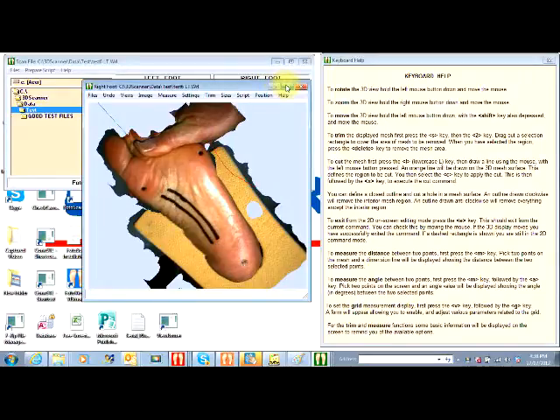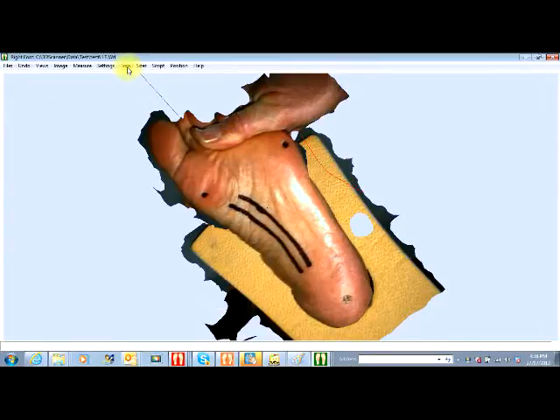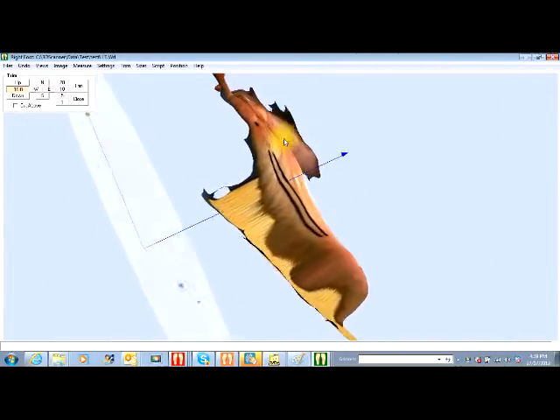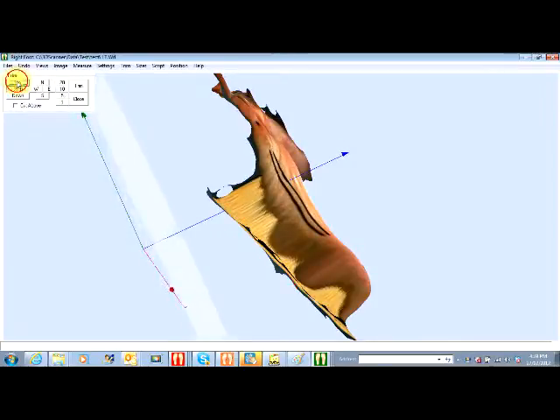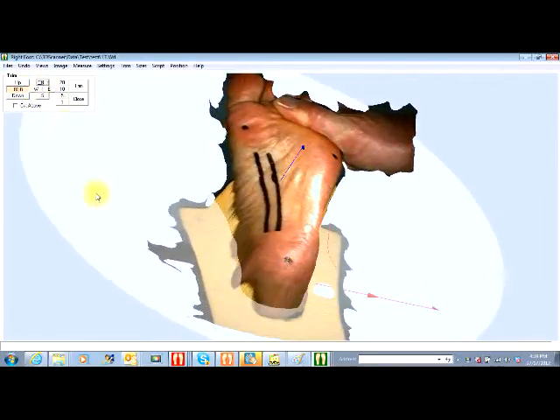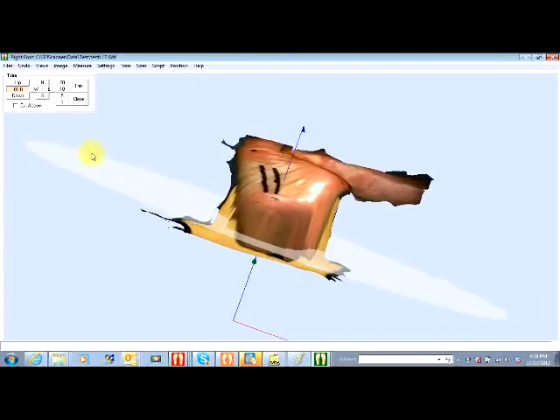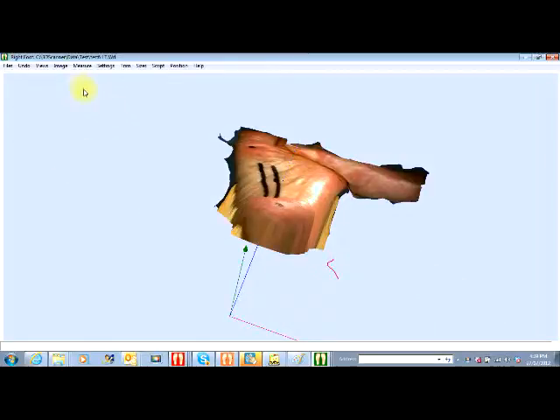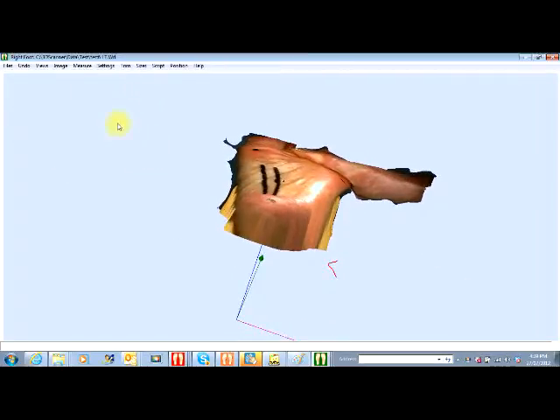Right, some of the other commands that we have, I have a larger trim function that will trim plane, as you can see there on the screen there. So bringing that up, keeping it below the peak of the arch, as you can see, by pressing trim, it concludes.